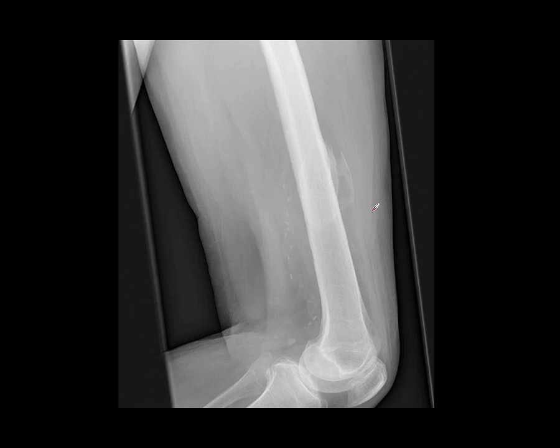Sometimes we are asked to perform bone scintigraphy on patients with myositis ossificans to see if it's active, because sometimes if it's painful, if we have post-traumatic myositis ossificans, if it's painful, the surgeon will consider removing it, but they will ask us to do a bone scintigram first to see if it's active. If it's showing quite a lot of activity, we'll wait, because the extent of ossification within the soft tissues may increase, and we'll only resect it when the activity has reduced to be equivalent to the adjacent normal bone.